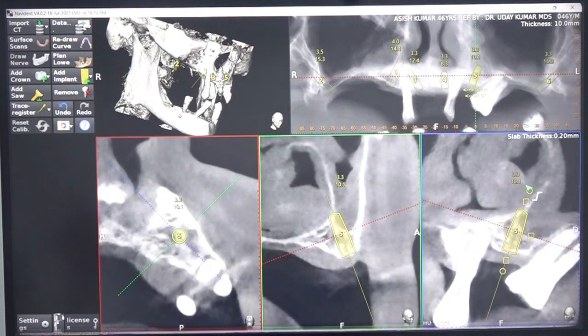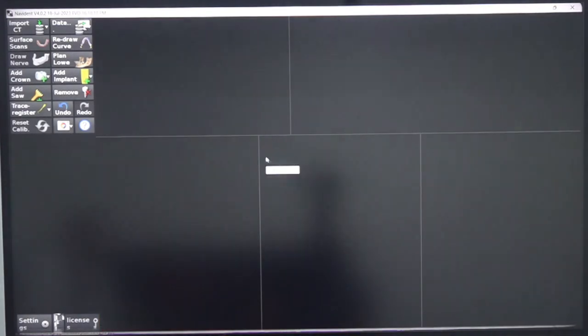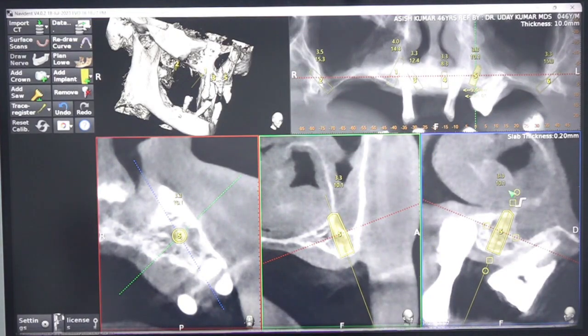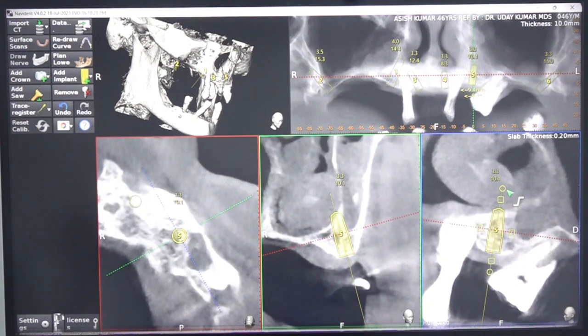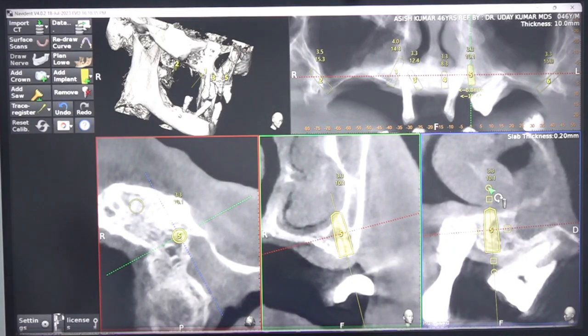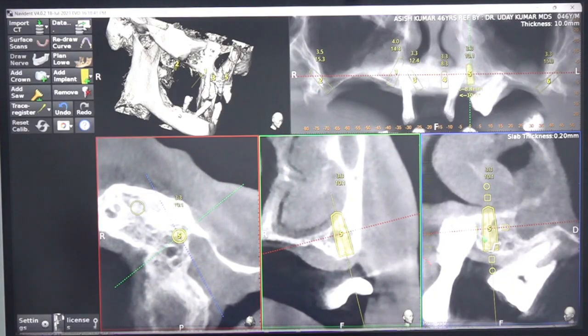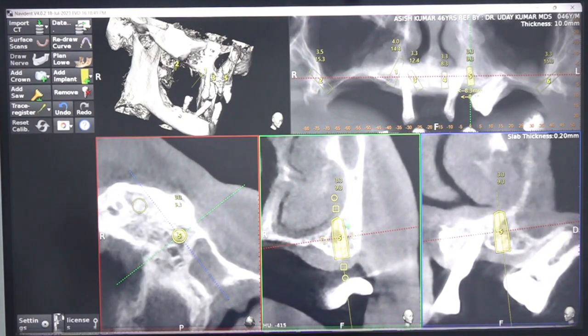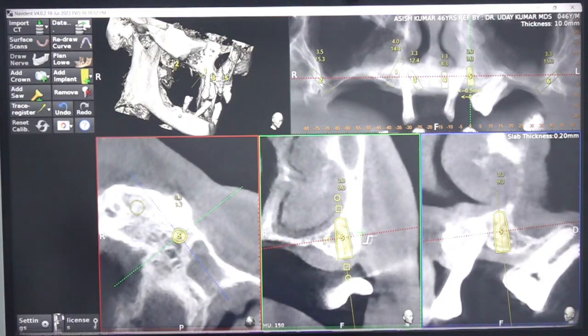You will see the first premolar axial now. This is the first premolar axial direction. Only a 10 implant. Sinus is expanded very much. You will tilt. You will angulate mesially. Mesially also the sinus is coming. Okay, very short. An 8 or 10 implant you can place, that's it, maximum. Not a good length of bone here. An 8 or 10 implant, just distal to the canine.